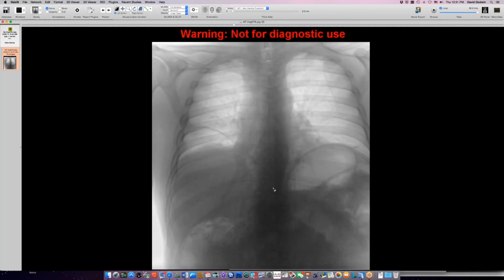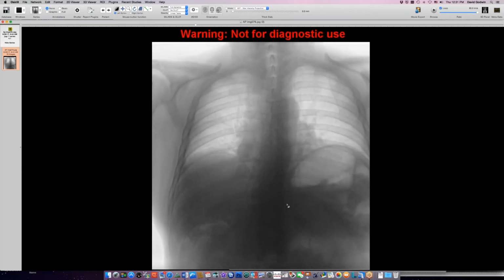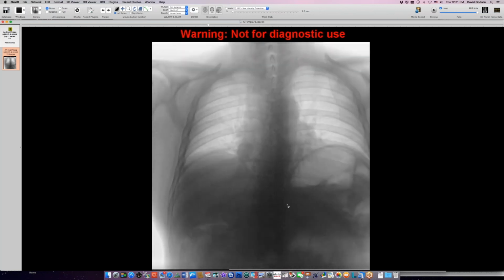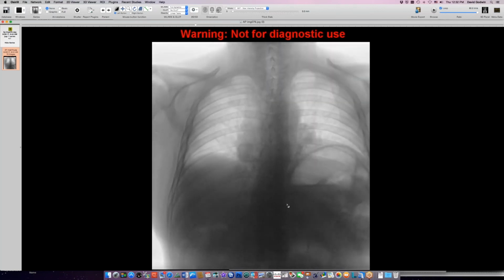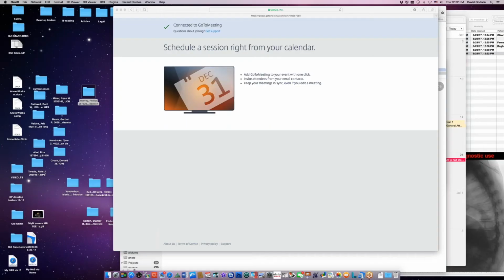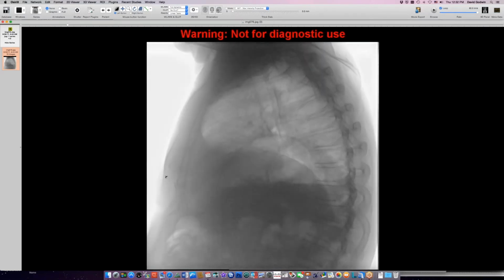But even on the frontal view here, I want you to look at the lung vessels in the base back here behind the dome, and you'll see that the motion of those posterior vessels, propelled by the posterior diaphragm, is a lot more vigorous than what we're seeing with the dome of the diaphragm. And this is characteristic of eventration, that there's a little motion of the dome, but there's a lot of motion posteriorly. So you get a hint of that here on this frontal fluoro, but it's harder to see than it is on the lateral.